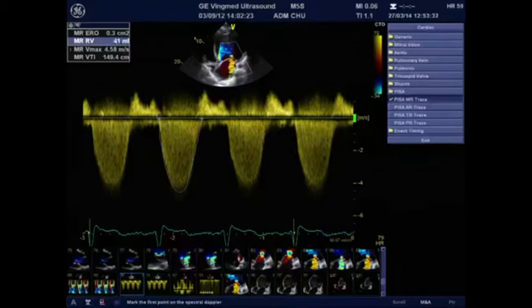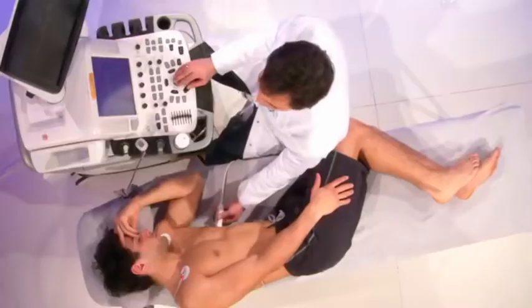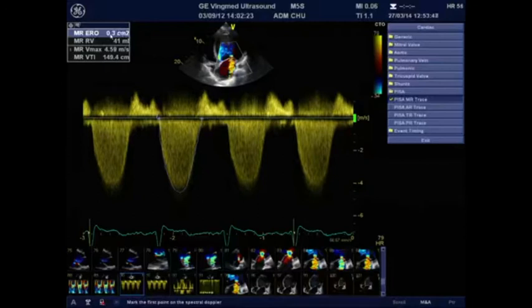But in case of secondary MR, due to the disease of the left ventricle, and also I will show you the shape of the flow convergence zone and the regurgitant orifice, it has been shown that a value greater than 20 for the effective regurgitant orifice area is prognostically important, and we should probably consider an effective regurgitant orifice greater than 20 as indicative of severe mitral regurgitation in the context of secondary mitral regurgitation related to the ventricular disease and the severe remodeling of the left ventricle.